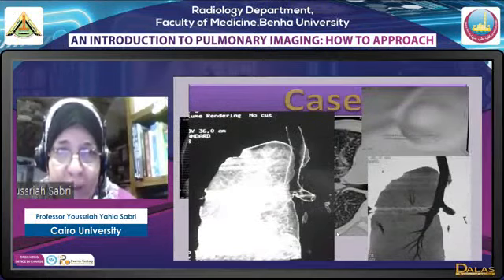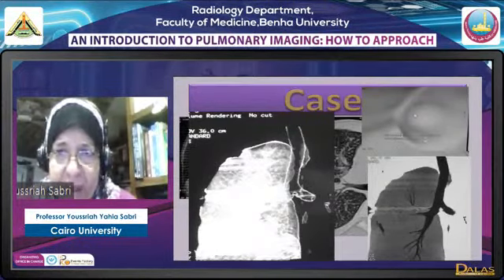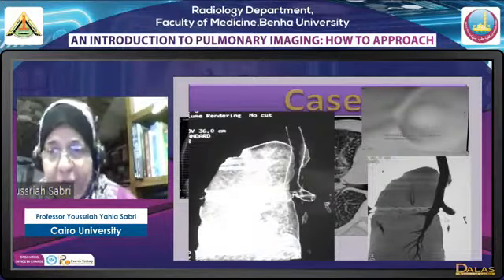Now this is a virtual bronchography. Okay, the upper one on the right image is the VB image, which is a 3D image simulating the bronchoscopy, and you see the total obstruction. The one on the right below is the MINIP image, and you see the bronchial tree.